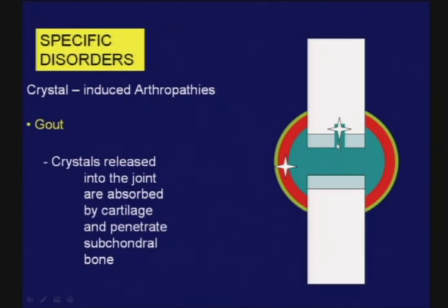But one of the interesting features that you all know is that on conventional radiography, gout, as compared to rheumatoid, may not be associated with joint space loss. And it's shown here why, because the destruction of the cartilage is focal, and around areas of destruction, the articular cartilage may be preserved.